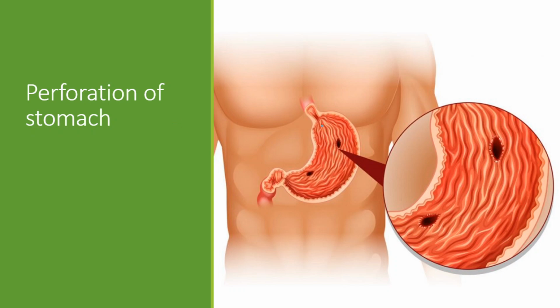And if you look at the stomach, there is a cavity with air.